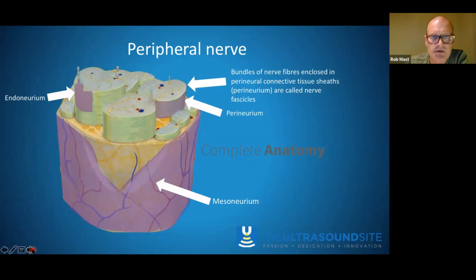And the fascicles are actually what conducts the nerve pulses, and they're a different type of structure in the sense that they're not as compressible and not connective tissue. And the structures that I mentioned, the epineurium, the perineurium, and the mesoneurium, are all connective structures, and that has consequences because on ultrasound they will show quite differently. So next slide, please.